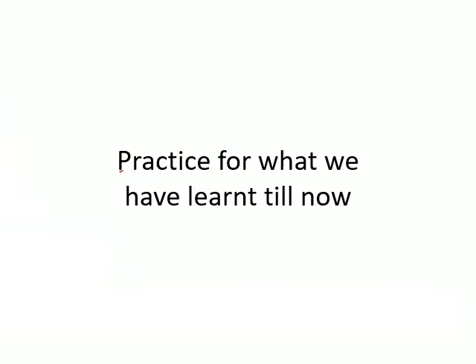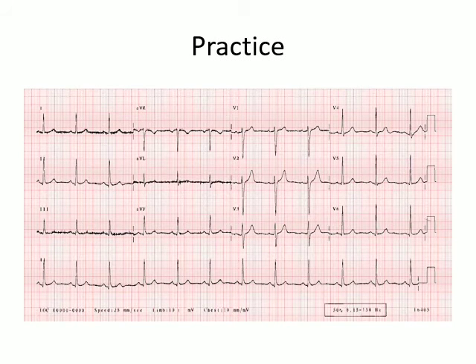Now let's practice what we have learned till now. ECG is all about practice, practice and practice. The more you practice, the better you get at the ECG. This is the same ECG that we discussed in the previous slide, which had a heart rate between 75 and 60, a regular rhythm, and was in sinus rhythm.